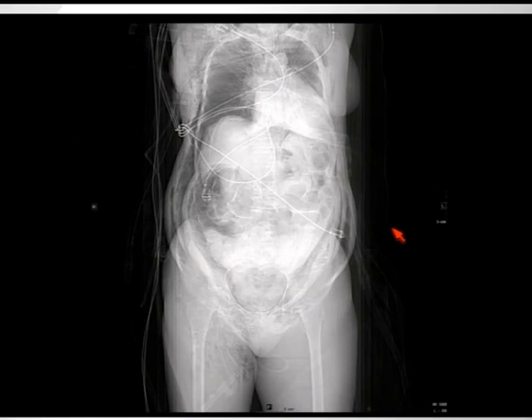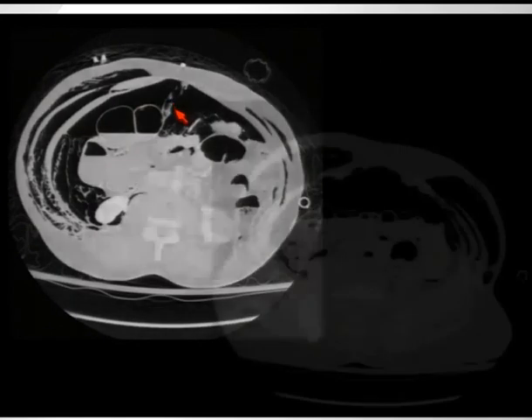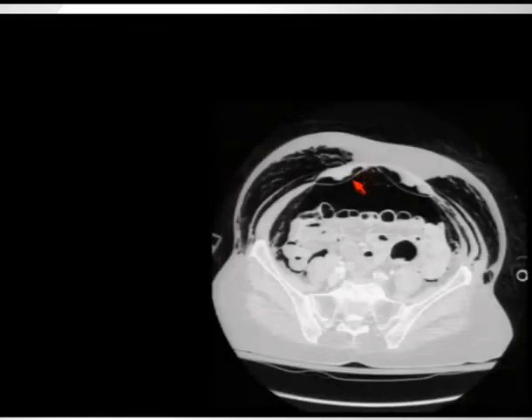This is a dramatic example of the pseudopneumoperitoneum. Obviously, the patient has massive gas leaks throughout the abdominal and chest wall, and there is pneumoperitoneum without a bowel injury, but there's also gas outside of the peritoneum trapped between the parietal peritoneum and the abdominal wall musculature. This is the so-called pseudopneumoperitoneum. Unfortunately, not all cases are as easily diagnosed as this one.